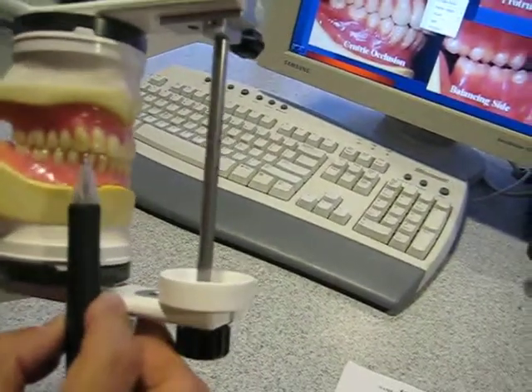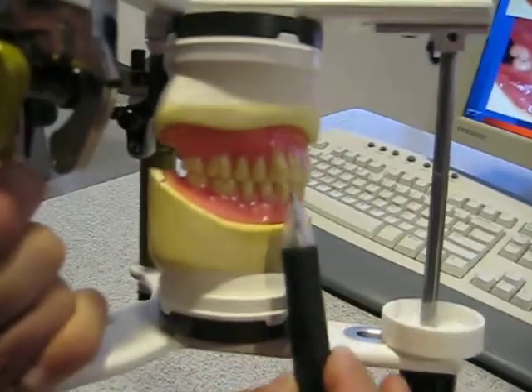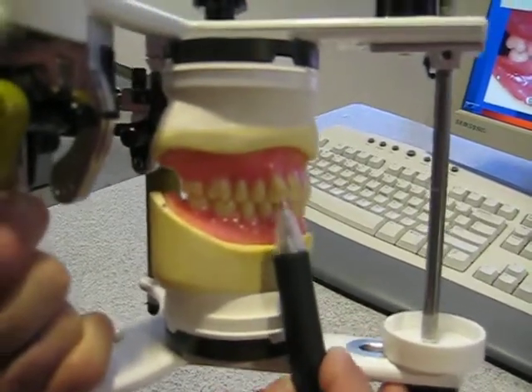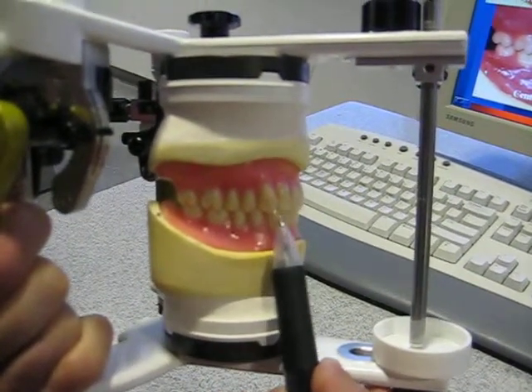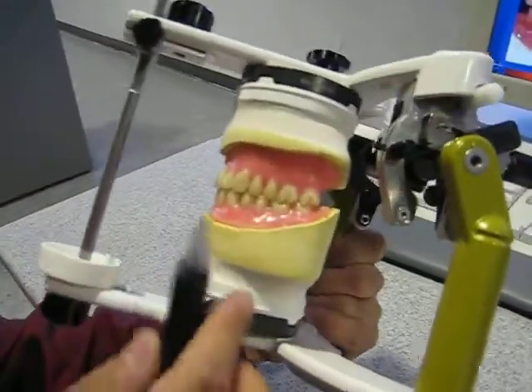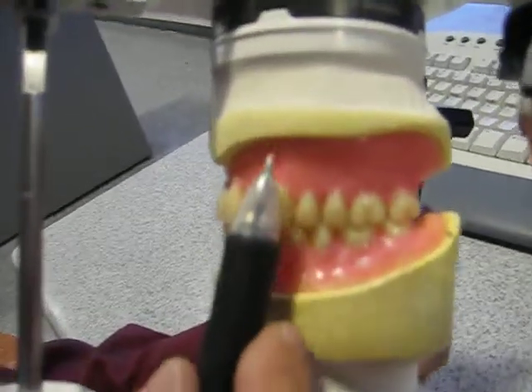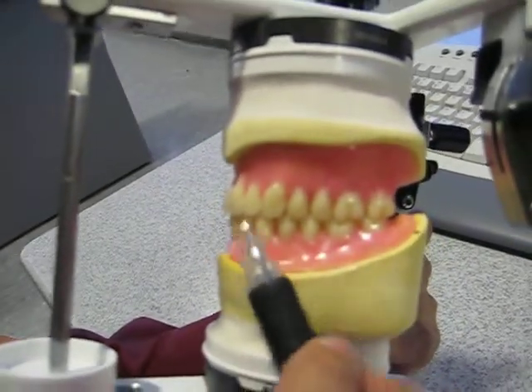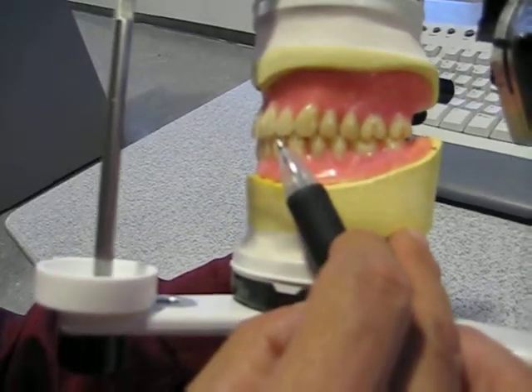The canine is perhaps a little bit too vertical, and that may affect us in our excursive contacts of the incisal edges. So we'll take a look at that later as well. On the patient's left side, this is a little bit more of what we want in the maxilla, in terms of the 15-degree angulation. In the mandible, in order to take up the space, you notice that the angulations may be a little bit excessive here.